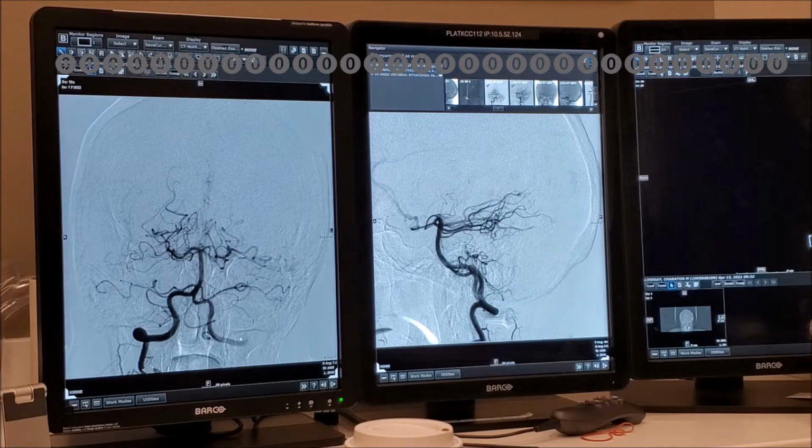You ligate the external carotid artery, yes, there will be cross circulation, but the anastomosis of the occipital to the vertebral on a ligated side is much better. If you're looking where the ligations are, look to the ipsilateral circulation, okay?